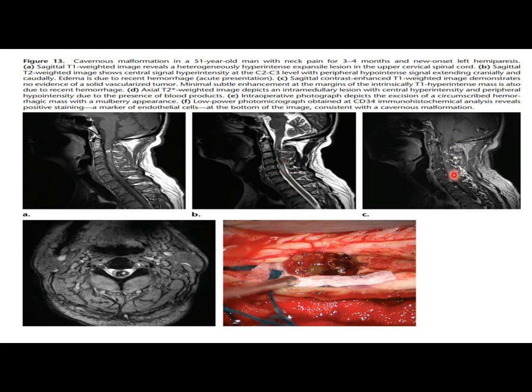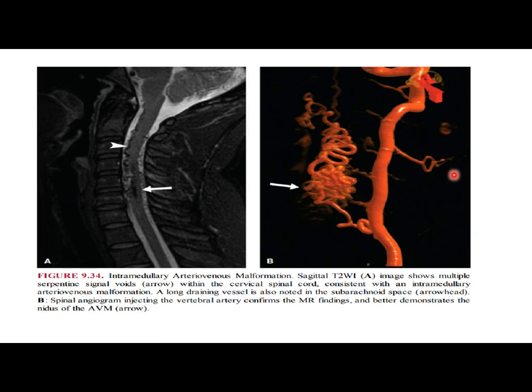On the other tumor we have... Why no significant enhancement? Because it's slow flow. It is vascular, but slow flow, so the enhancement is not very obvious. You can see multiple serpiginous flow voids here and there. This is an AVM, arteriovenous malformation, not a cavernous hemangioma.